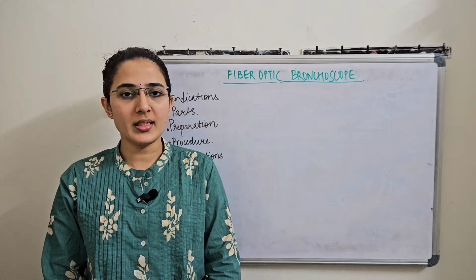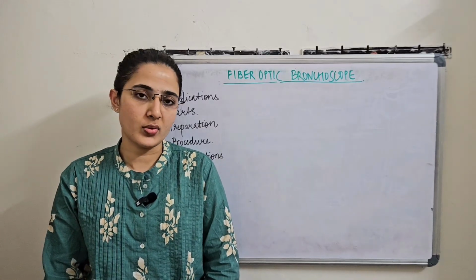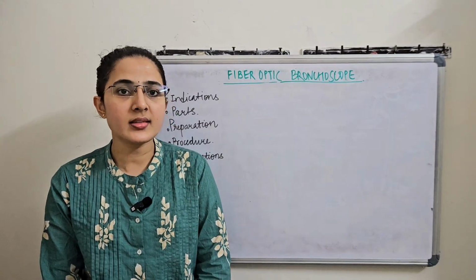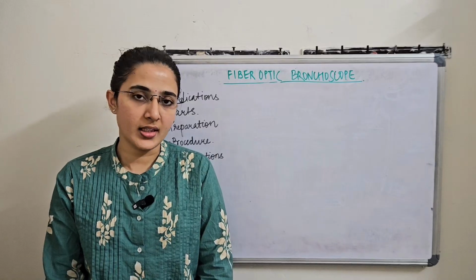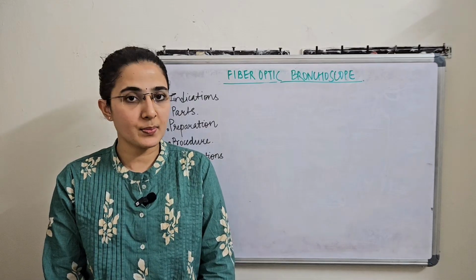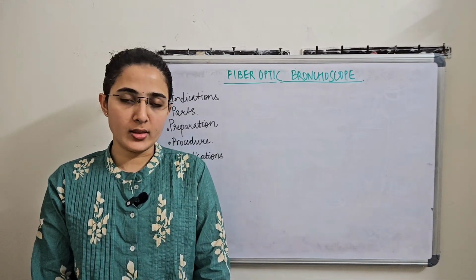Today's video will be discussing an important instrument, that is the fiberoptic bronchoscope. It's an important instrument that we use in difficult airway algorithms, and it also forms a part of the difficult airway cart. It's an instrument which requires proper understanding, technique and experience for its proper and optimal use.